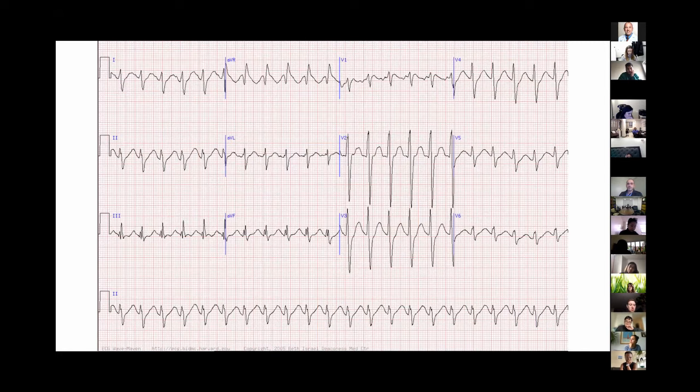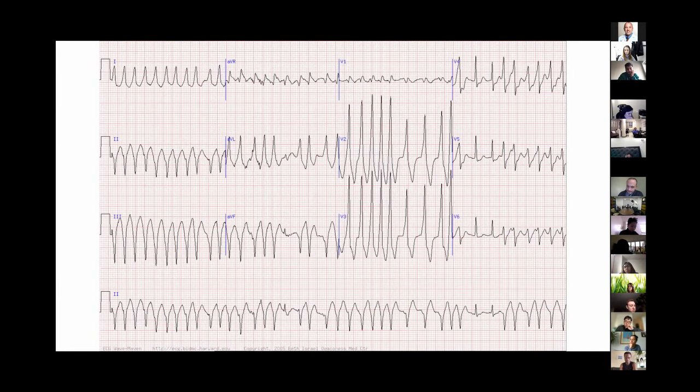All right, so just one question. In that EKG, are there delta waves? Are we supposed to see them? Which one? Are there delta waves on this EKG? Correct. Technically, for example, if you look at V2, you can appreciate it in V3, and even in the inferior leads here there's a negative delta wave, because a delta wave can be both positive and negative.